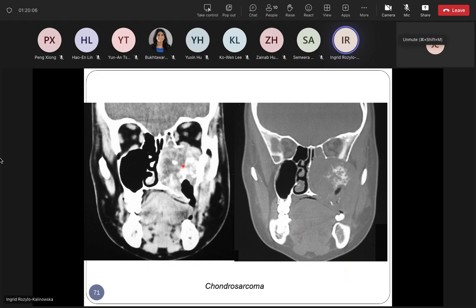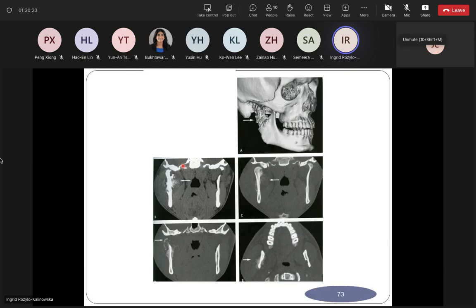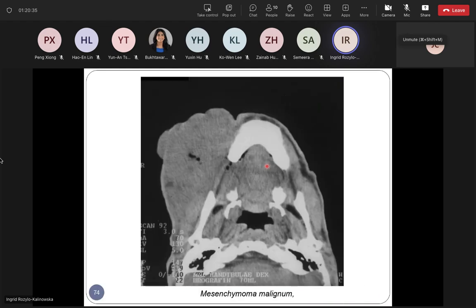this tumor. And in this lady, she was really lucky because despite the extent of the surgery, she survived. So this is a follow-up 5 years after surgery. So here you can also have a look at sunburst appearance together with soft tissue tumor. And this was our patient who had been a very patient patient.